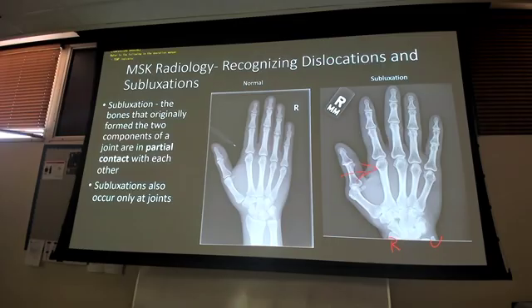I haven't shown you anything with the skull yet, so we'll get to actually talk about the skull. A lot of stuff. Let's just know that it can be there. So when you do a skeletal survey sometimes, you're right.